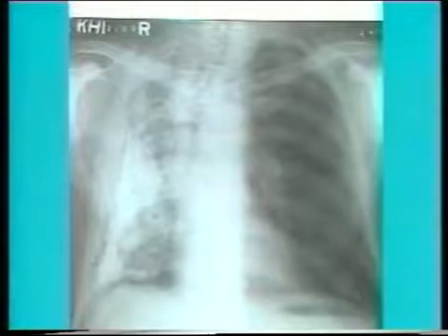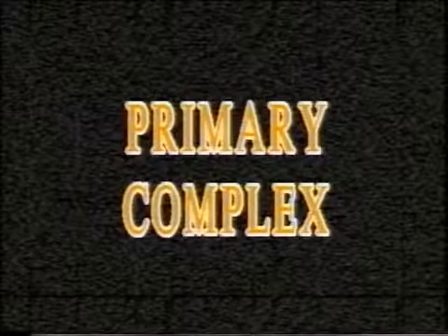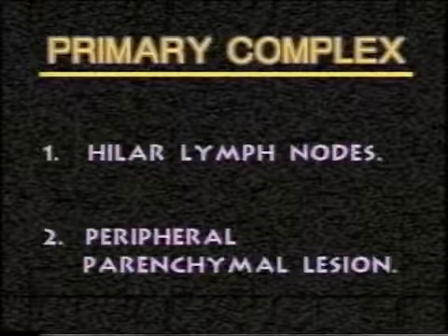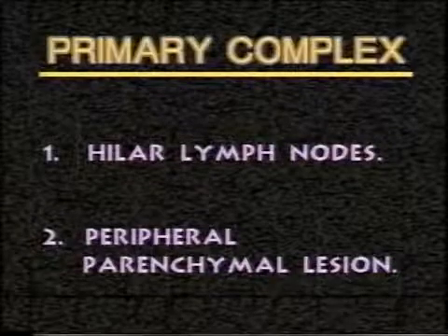This is another X-ray of pleural calcification with dense irregular sheet-like opacity. Note in the close-up view its density, pattern and the typical appearance. Primary complex. Primary complex is a primary tuberculous infection seen in children. Radiologically, it shows two components, a peripheral parenchymal lesion and enlarged hilar lymph nodes.